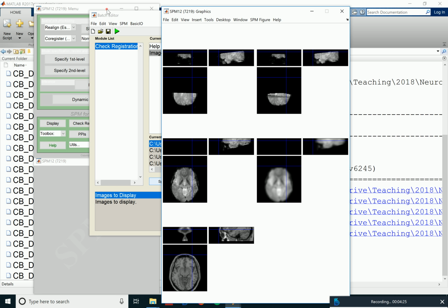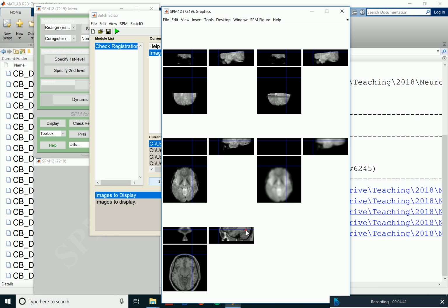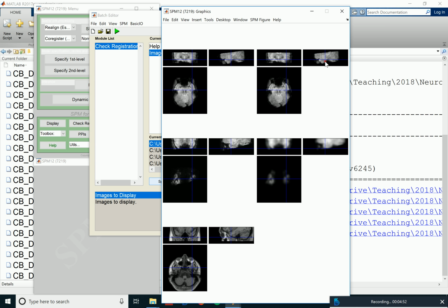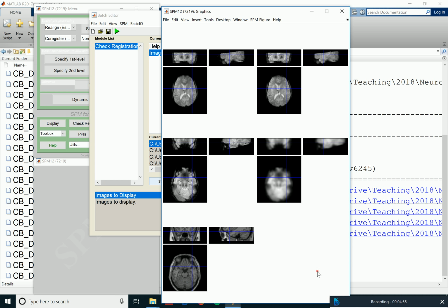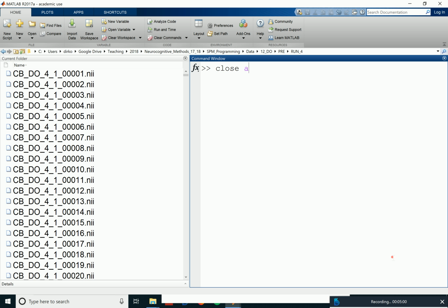And from using this, you can, of course, as I said, also automatize this. But you should, at this point, also have a look at the images and roughly make sure, like we did in this case, that the big anatomical landmarks are actually there where you want them. And if you have more EPI data than we have here, because we only have the stack, then it also might look a little bit nicer and you feel even more satisfied than you do now.